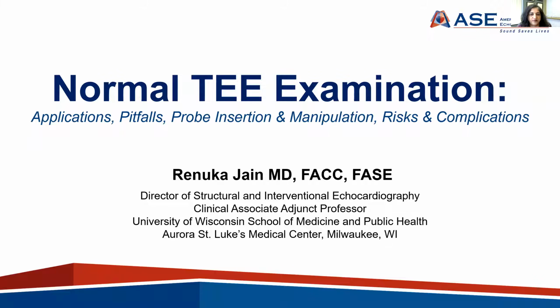Hello, this is the normal TEE examination. In this talk, we will introduce the field of TEE, highlight the applications, the procedure itself and its complications, and then also highlight material that's pertinent for your echo boards.